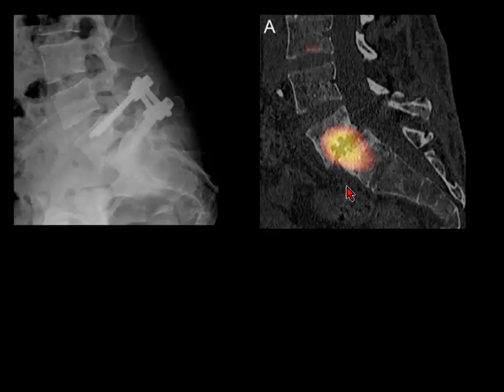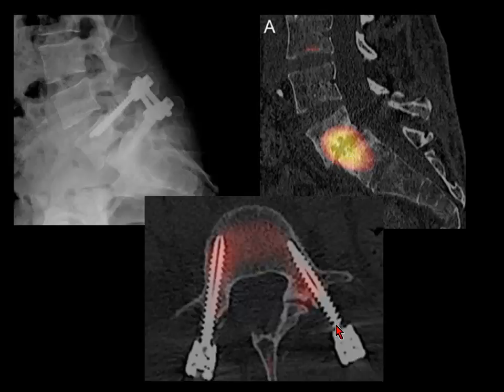This one is lumbosacral fixation, end plate changes, listhesis, and they fixed it. And this basically shows intense uptake, and this one basically doing a SPECT shows a fracture of the proximal part of the screw, which is probably causing some movement in this. So it basically highlights the significance and importance of SPECT CT as a dual modality, showing the functionality and the morphology together. Thank you.